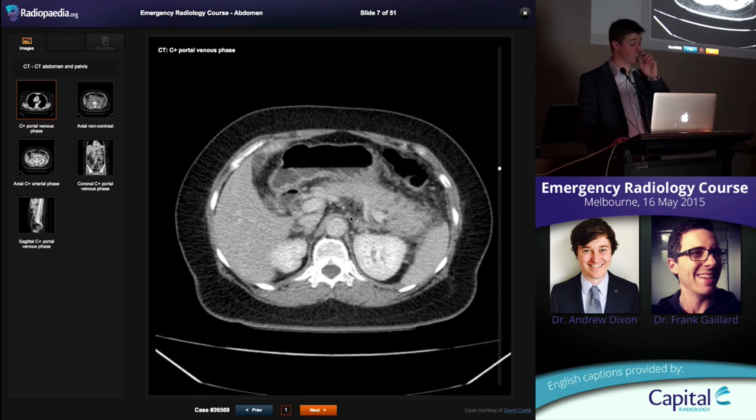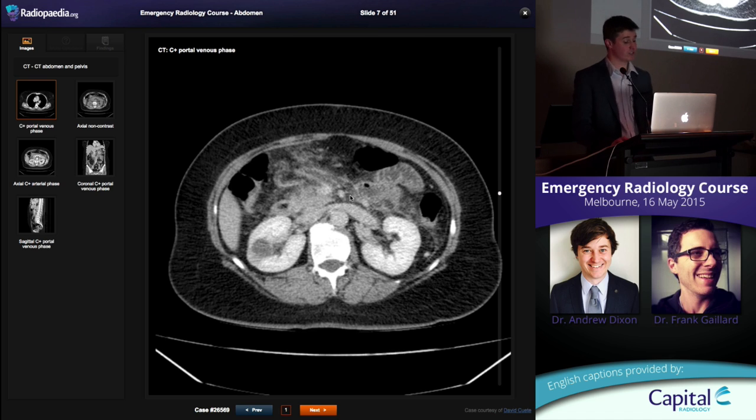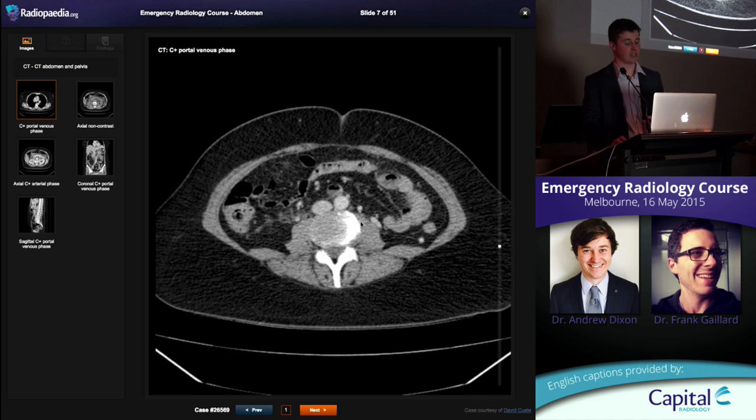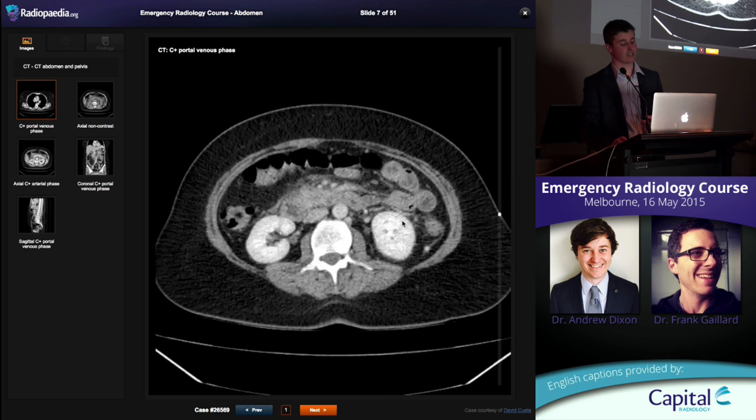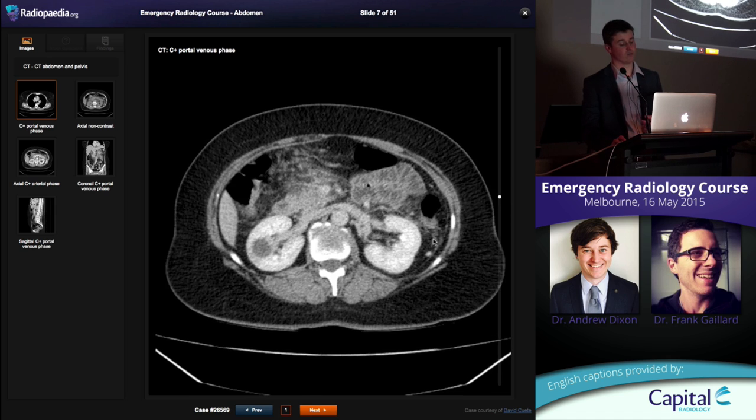It's a retroperitoneal structure. It's in the anterior pararenal space. So you don't usually expect to get a lot of free fluid associated with it, but you do expect to get some stranding, tracking in the retroperitoneum in front of the kidney here, tracking right out into the paracolic region, okay, retroperitoneal.